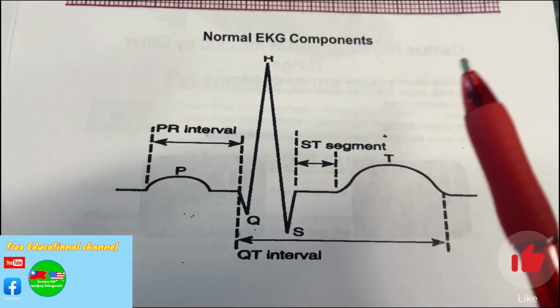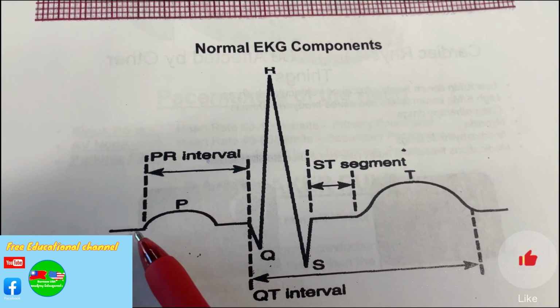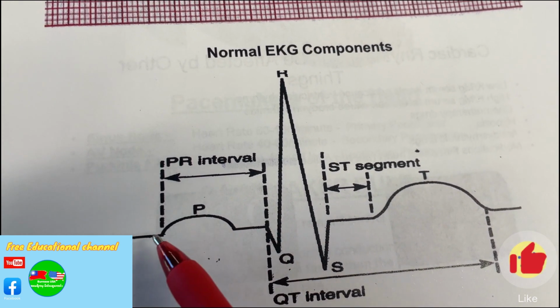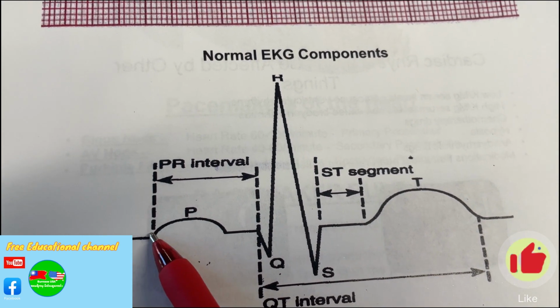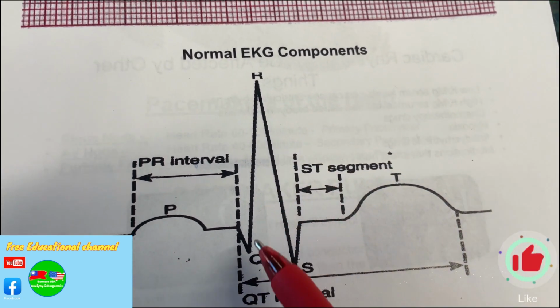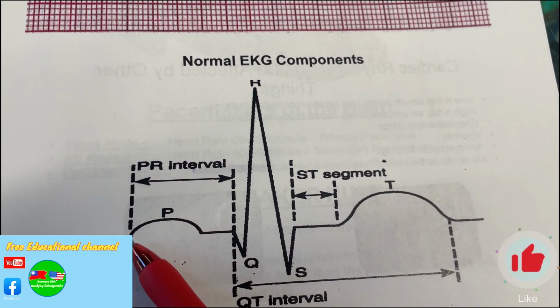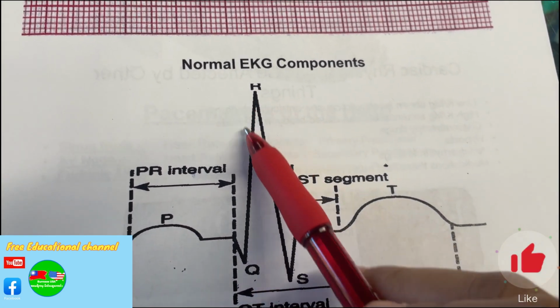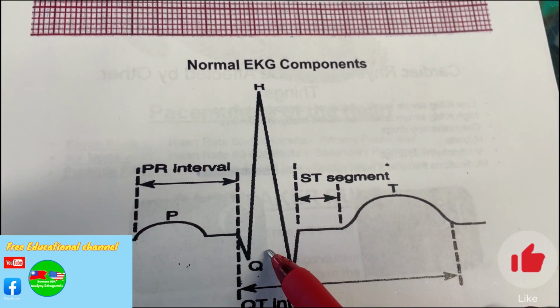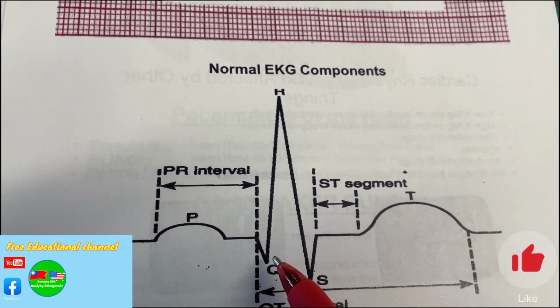Okay. Then ECG components, we have PR. That means it doesn't start from the tip. Okay, it starts from where the P starts. That is the P wave, which denotes the atrium contractions, and then you have Q, R, S. So you have a PR that goes all the way from P to the start of the QRS. R is starting somewhere here. Yeah, so that is atrium activity.